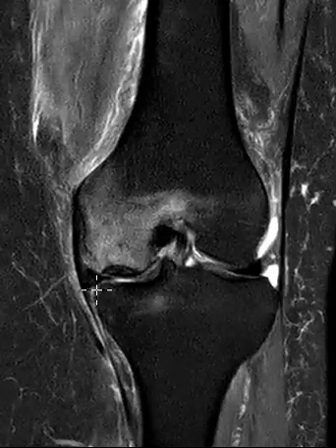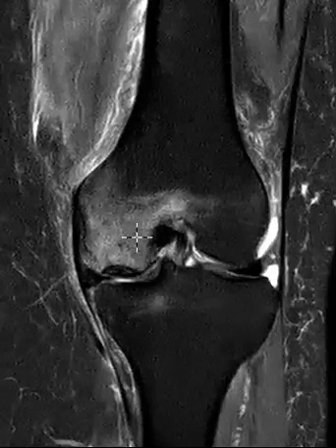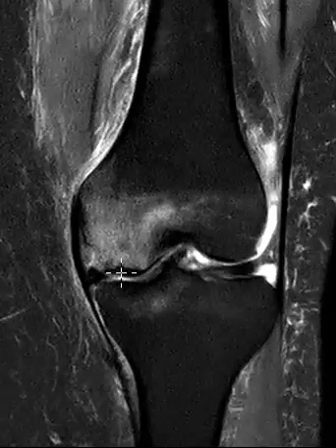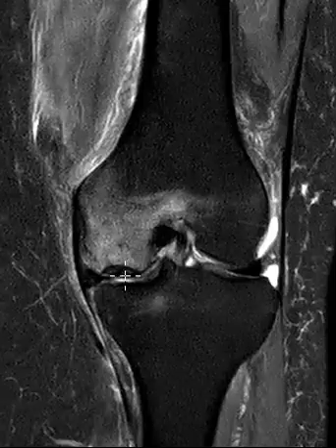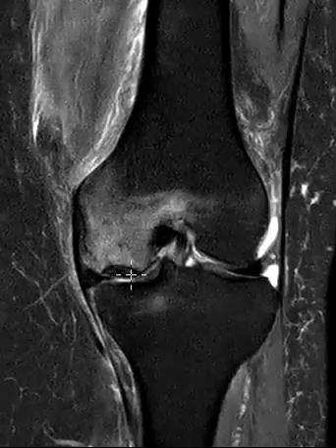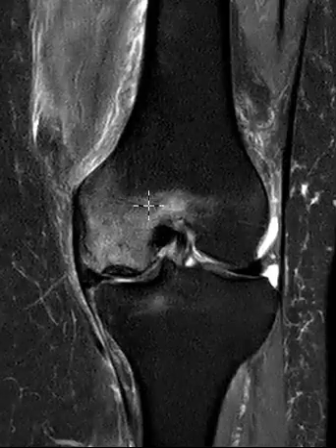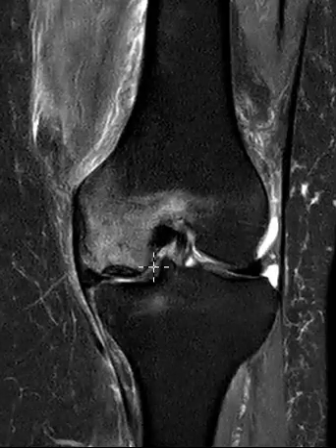When it tears, it drifts outwards and it's not doing its job, so there's abnormal mechanics of stress. And then you get a stress-type fracture. You get compaction of the bone underneath the articular surface. It starts to collapse, become dark and sclerotic, and then you have this bright signal, reactive marrow edema.